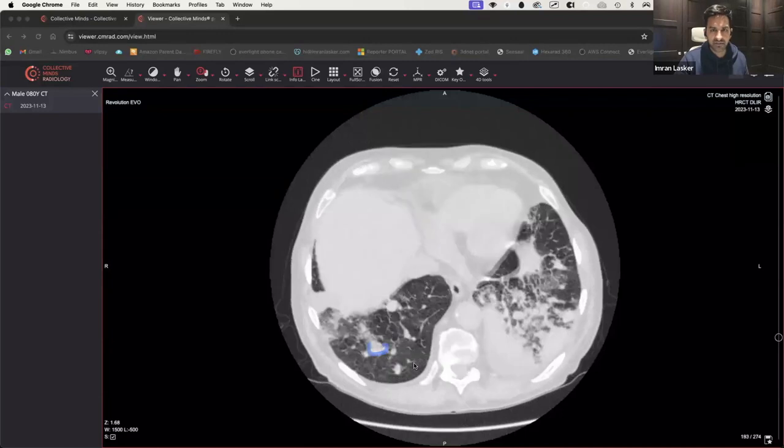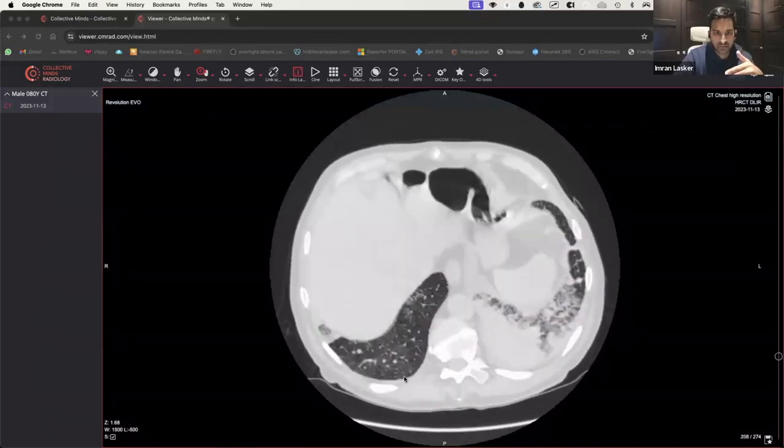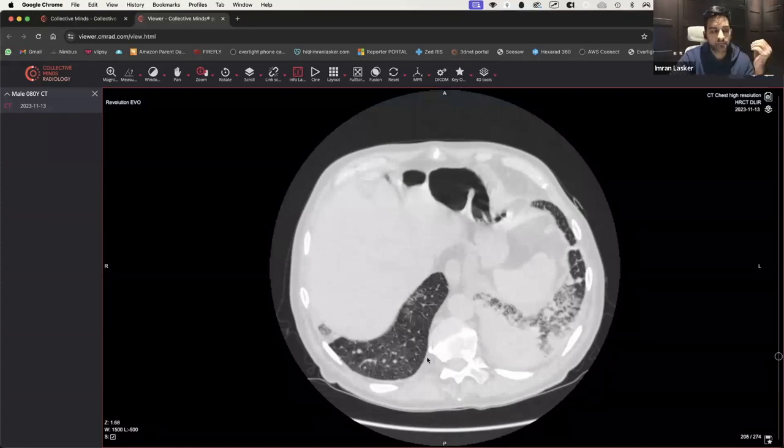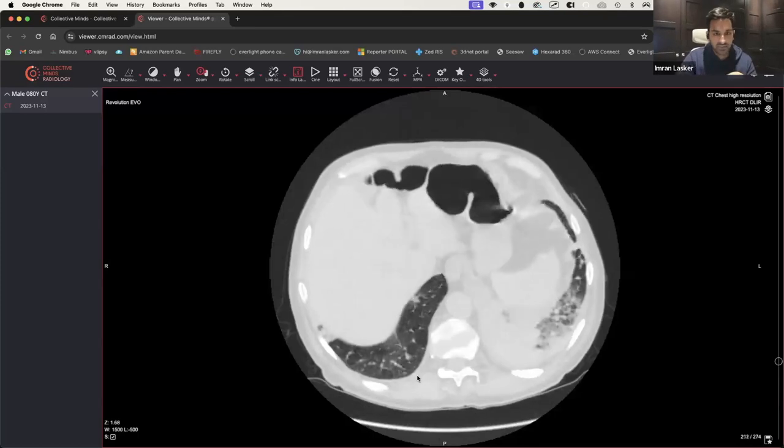And especially at the lower lobes, you've got to start wondering, okay, we've got multiple lower lobe lesions, right? And they look very circular, very, very spherical. So that one there, and that one there. And with a malignancy anyway, you'd be more likely to get multiple metastases in the lower lobes, and that's because of the way the blood flow is. Because if someone's standing around, in theory, the blood would be in the lower areas of the lungs, and that's where you get more of your metastases. So that's something that we are worried about.